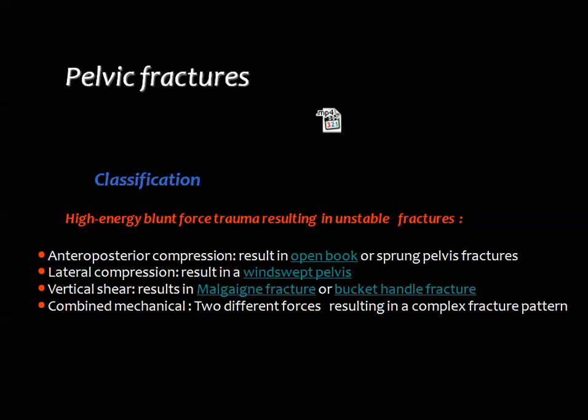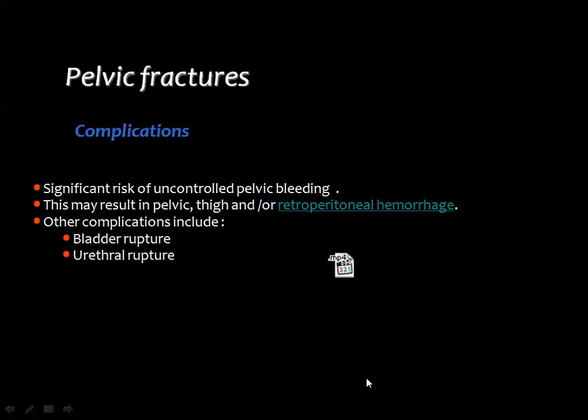Okay, we'll continue. I think this is a valuable video for you to understand the types of the pelvic fractures. And now this is one of the most important complications emphasized in the previous video, and is also emphasized here, which is the risk of massive bleeding, which requires blood transfusion.